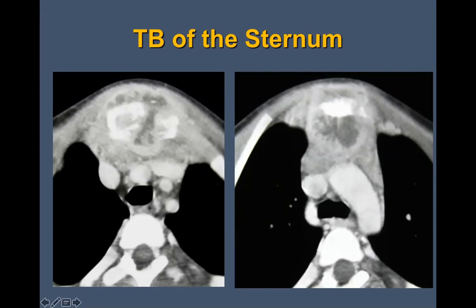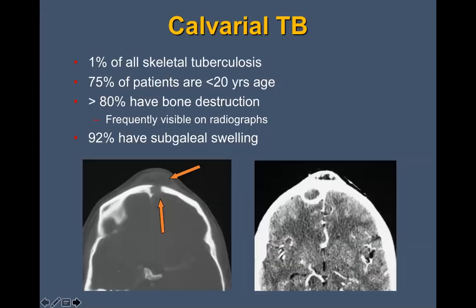So you can see how TB can be very confusing when it gets outside of the chest. And the last area is really skull involvement. That's a vast minority of cases, but still it is one of the common things that we see more in children than in adults. Usually you'll have significant bone destruction, but you can have both extraosseous and intracranial extension of the area of exudate.